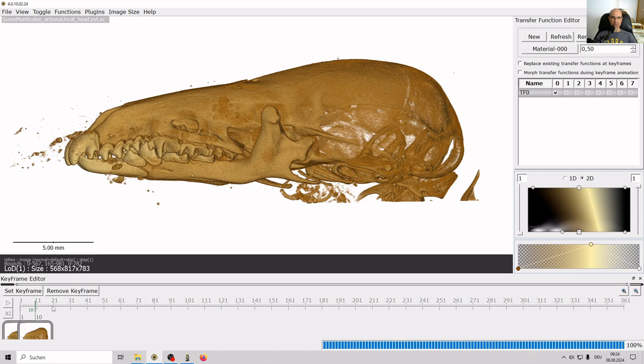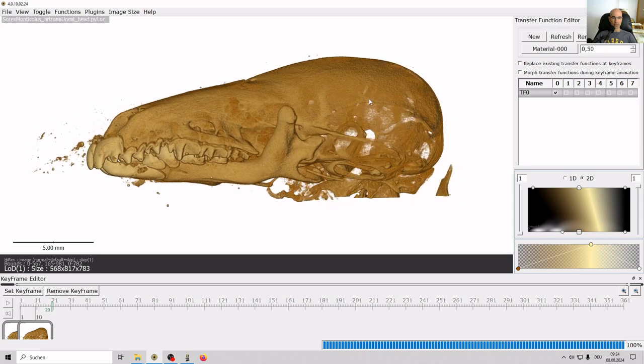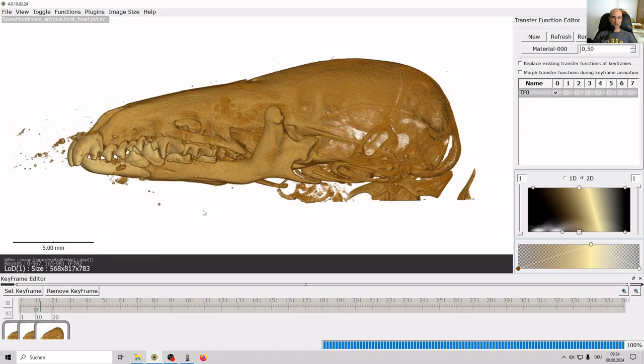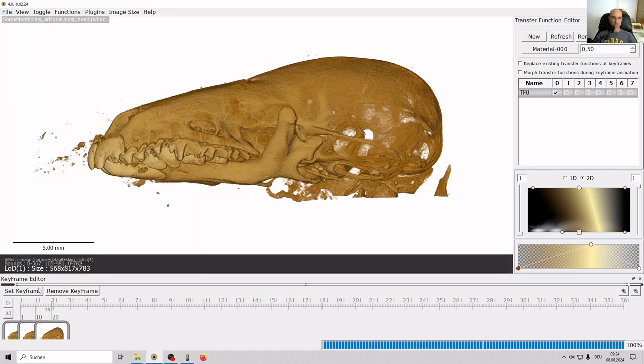You may recall in the previous video when I did just one in the beginning and one at 90, it zoomed way in and lost a lot of the image outside of the field of view. So let's make one more for now, and then after this we'll make a label. So I'm going to set the next image at keyframe 20. Move the movie back to 1 just to see what we've got so far, and there it is. So that's pretty good, if I say so myself.